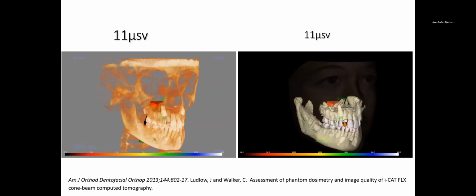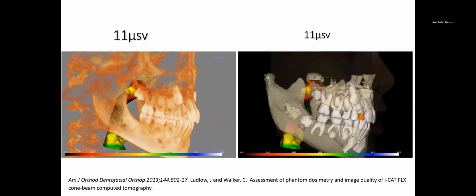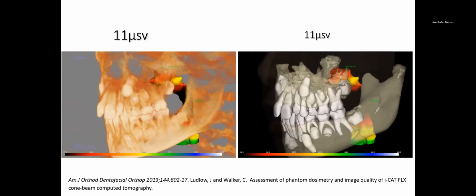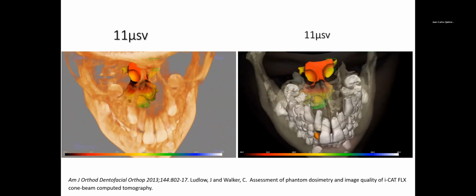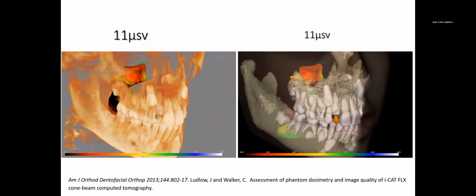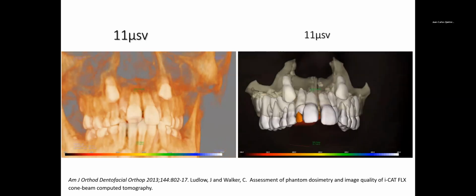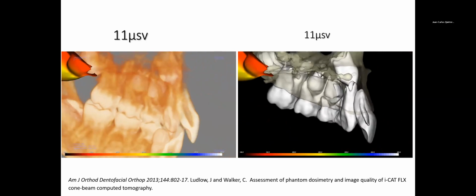Okay. All right. So, ladies and gentlemen, here's the Anatomodel, Invivo model from that 11 microsievert cone beam. Keep in mind, a Panorex is more than double of that. So you can see here the great advantage in clarity, movement, sutures, airways, design, treatment planning.